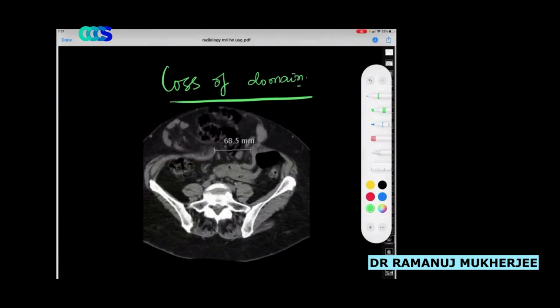In this patient, what is wrong with what muscle? Rectus. Very good. Number one, not only the rectus, sir. See the status of the three muscles. If this is normal, this muscle appears atrophied. Now you understand how we plan around the component separation.